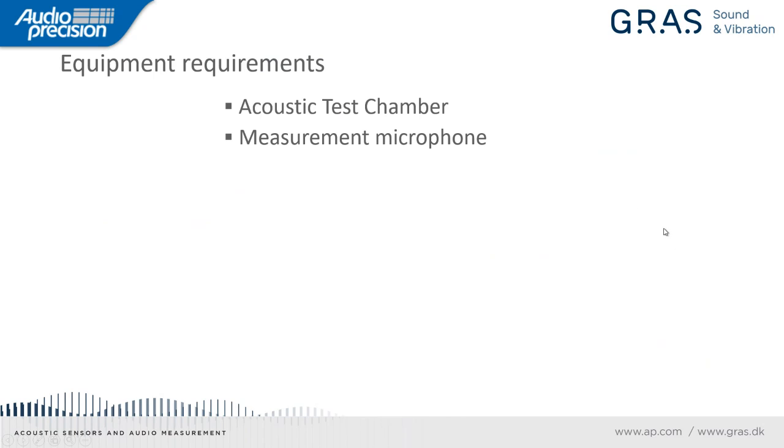We need a measurement microphone. It's very important. The standards call for a 2cc coupler. So this is a simple coupler that has an internal volume of 2 cubic centimeters. That's standard for hearing aid tests. We need a sound level calibrator. So we want to be able to set the sensitivity of the microphone within our audio measurement software. It's also a good idea to check that we have a good signal connection with the microphone because we're measuring sound levels voltages at quite a low level, typically with a measurement microphone.